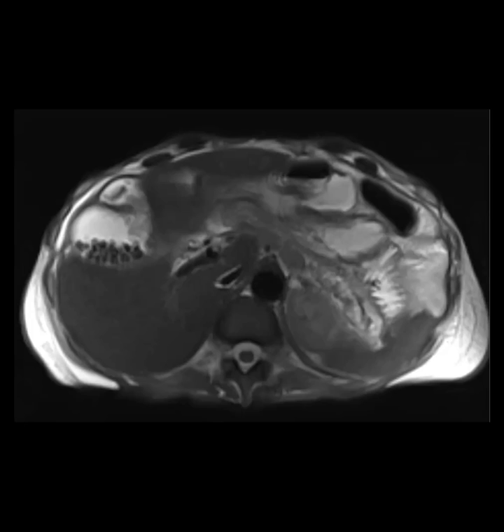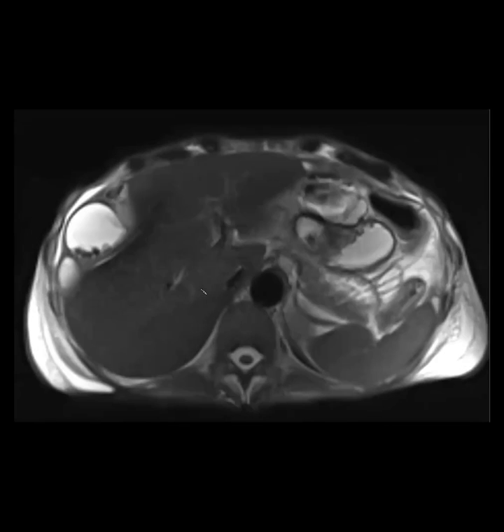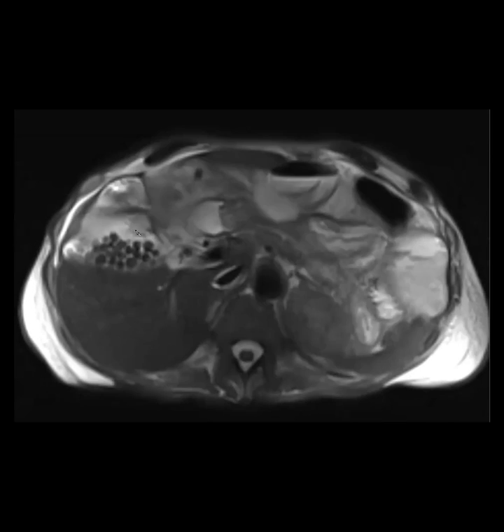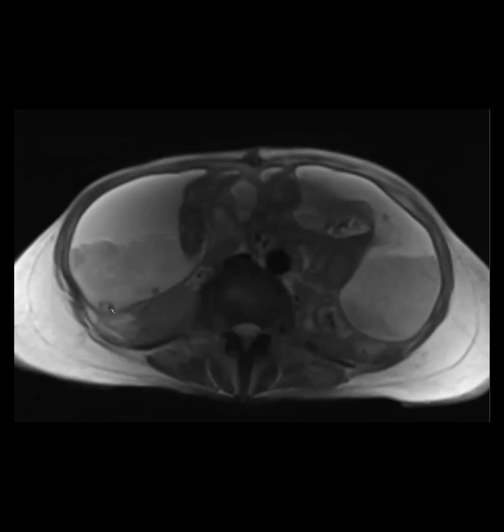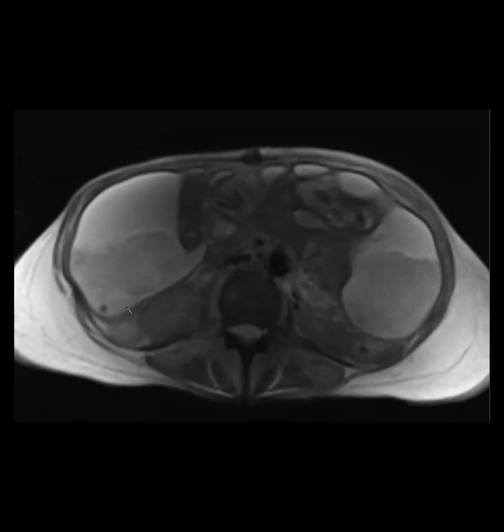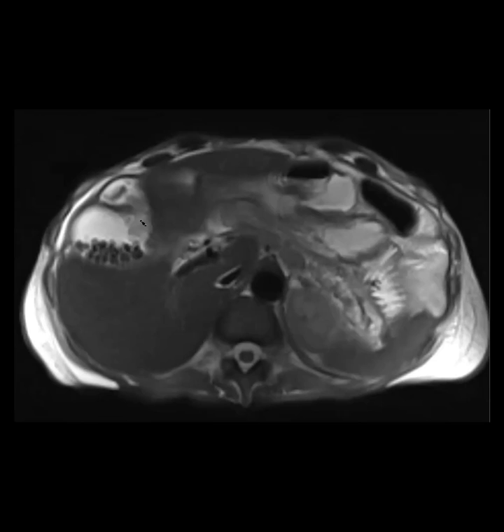So this is just a little bit of a show and tell case. This was a patient who was quite sick, and you can see the gallbladder is full of stones, and there was actually this frank rupture of the gallbladder with all this fluid in the abdomen, and you can even see some stones layering in the gutter here. I'd just never seen a gallbladder perforation fill up the abdomen with this much bile and this much extravasation of stones, with the actual location of the perforation seen here.